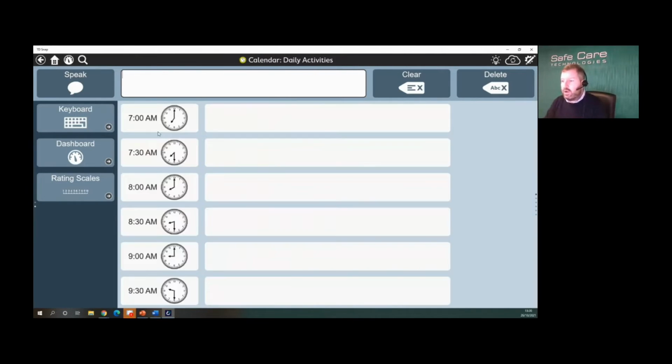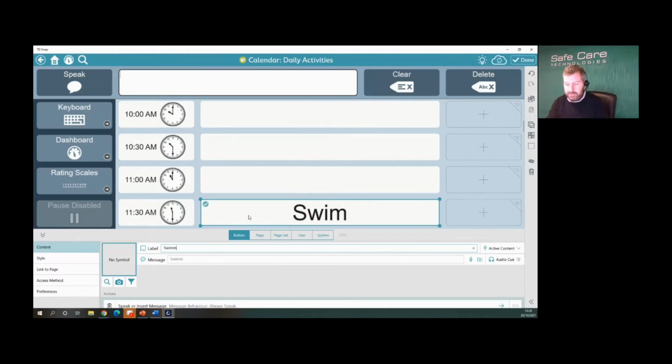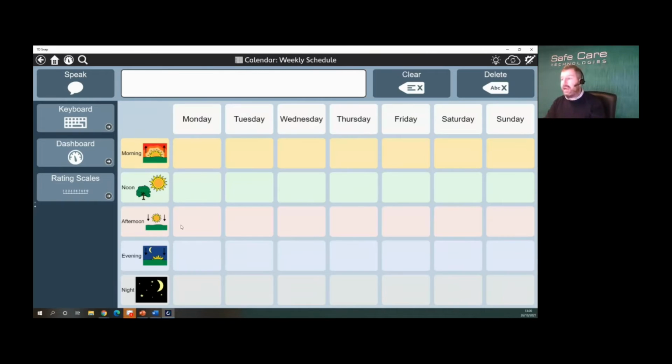So again, we could put in what we're doing today. We could put down a visual, at 11:30 we've got swimming, and I can create my whole schedule for the day, or I can use the weekly schedule where again, okay, I want to see what I'm doing each week.